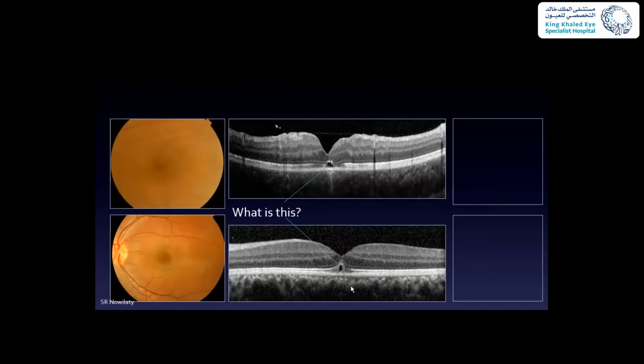Okay, what am I doing here? So yeah, what is this? I'm asking here, what is this thing? Okay, what are these structures here? What's happening here? What do you see? Do you see a continuity or no? What is missing here?